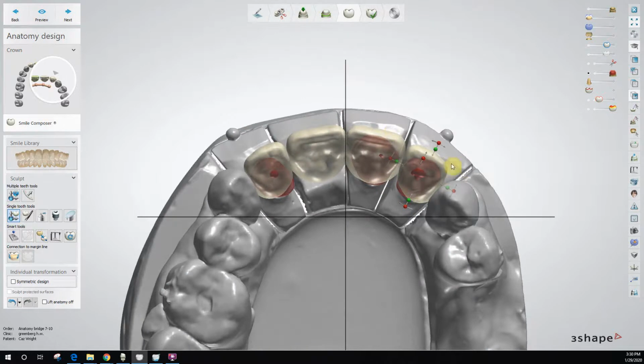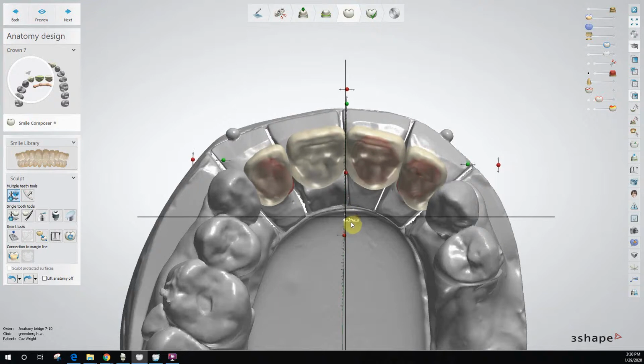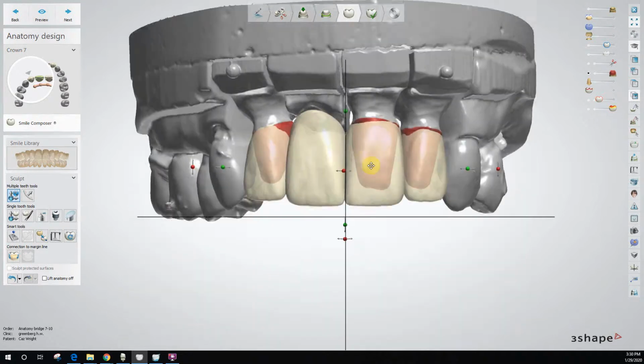Okay. Now what I'm seeing here is we've got a little winging out of the laterals here. Now I could do one of two things. It's another tool you can use. I can either angle this in, angle this in. Another thing you can do is, watch this, go back to the Q button, okay, grab this green handle, watch, see how the teeth are stretching? One other way to kind of bring those things in and just kind of soften things a little bit, okay, as a group.